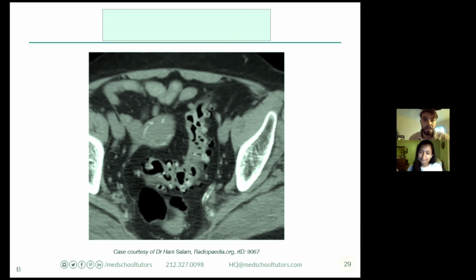If nothing was jumping out at me, I went to my vignette. And as we go to the center, we see this area that's soft tissue density, but also has these pockets of air. And how do I know that they're air? They are completely black, so completely radiolucent. And I also see next to those some areas that are more radiodense. So what do we think is the possible diagnosis here, everyone?